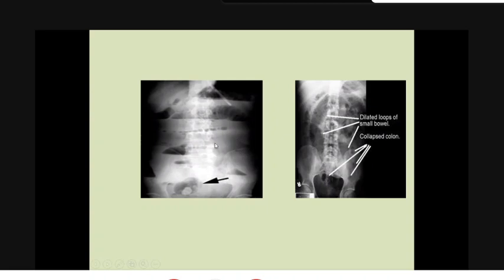In small bowel obstruction we said there is usually accumulation of fluid and gas. In cases of small intestinal obstruction that is completely filled with the fluid, the amount of gas will be very small. Small gas bubbles, these small translucencies that you see, will be trapped in rows between the valvulae conniventes.